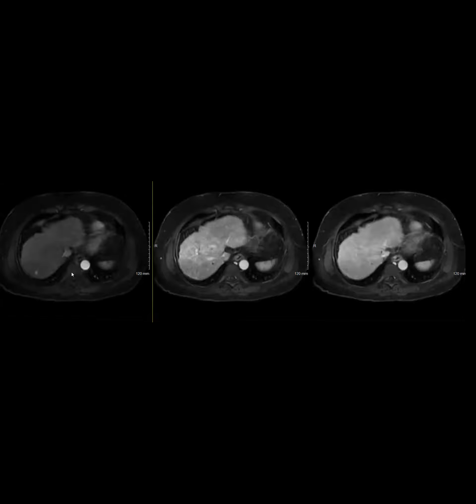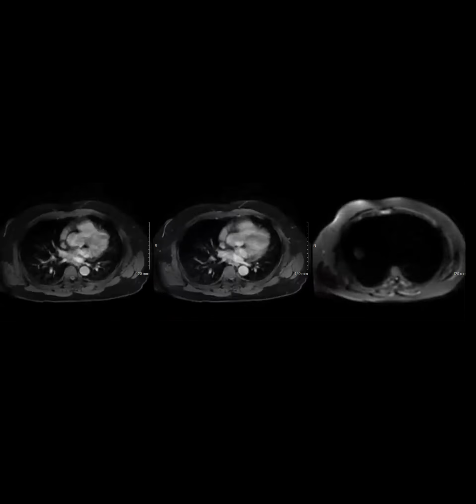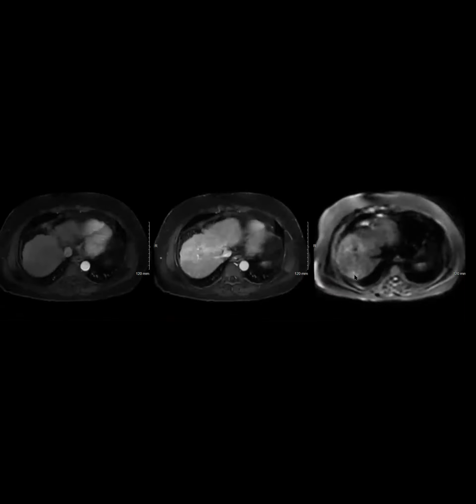All right, so this is a very interesting case that was brought up by our hepatologist, just past liver tumor board. This is a patient who had an MRI a few months ago. This is a pre-transplant MRI, and the MRI was read as having these foci of T1 arterial phase hyperenhancement. If you look carefully, you can actually see that there's a little bit of restricted diffusion corresponding to the same level.